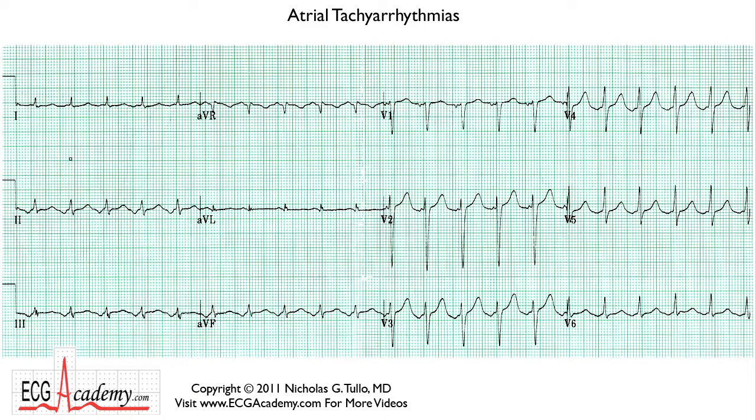Now, here's one example of supraventricular tachycardia, and this would be a patient who maybe walked into the emergency room with palpitations or lightheadedness. And this is a 12 lead, and when you scan across, you can see that the QRS complexes appear to be quite regular. And if you look for a QRS that lands on a solid line, you can count off 300, 150. It's about maybe 120 something. But remember the trick, look for two QRS complexes and count off that. So here's one and here's another. And those are exactly, let's see, 300, 150, 100, 75, 60.